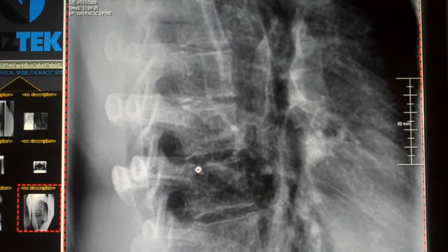We of course can see the vertebral body right here in this area. And so you see the vertebral body right here. You of course can see the IVF. And this structure that is going from the body back to the rest of the segment is called the pedicle. We do see the apophyseal joint that is right here between the superior articular process, which is on this side, to the inferior articular process that is on this side.